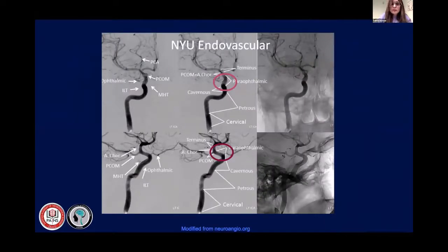So after the ophthalmic, we have this hypophyseal segment, which is not outlined here, but because he has put this mark of para-ophthalmic. In the para-ophthalmic, we have clinoid, we have ophthalmic, and we have superior hypophyseal. So superior hypophyseal is beyond the ostium of the ophthalmic up to the PCOM. You need not identify them separately, but you need to understand them once.